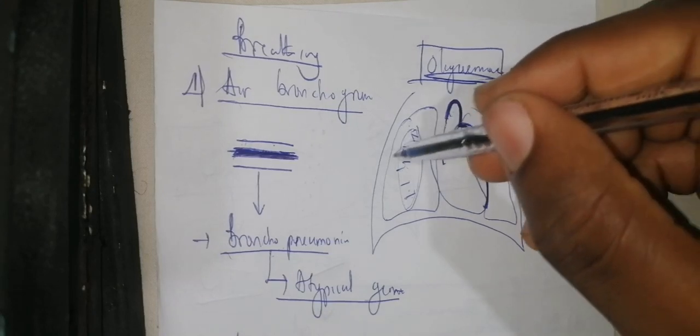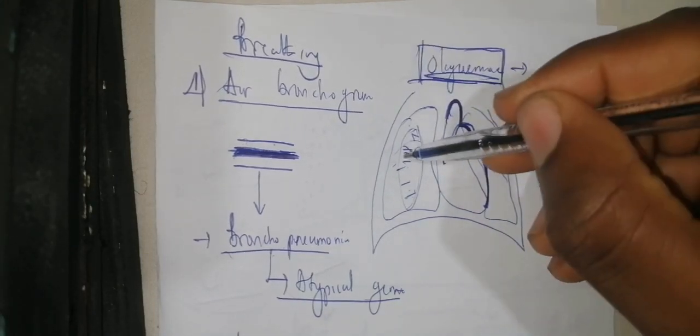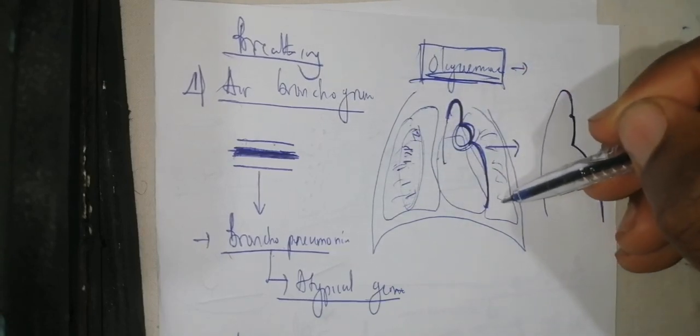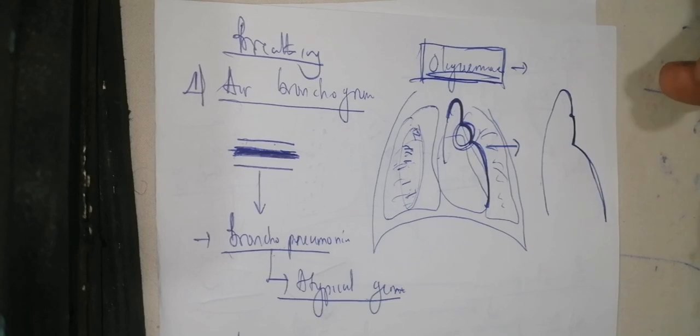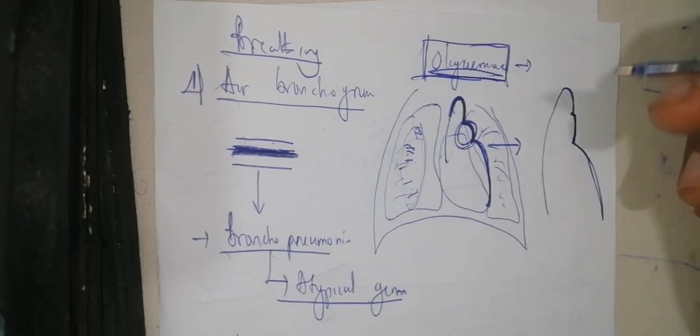Where there is reduced blood supply to the pulmonary circulation, you are going to have pulmonary oligemia, meaning that the pulmonary vessels are not going to be seen, despite a very good exposure. This is a very good exposure and penetration of the X-ray. So those are the different things that you can visualize.